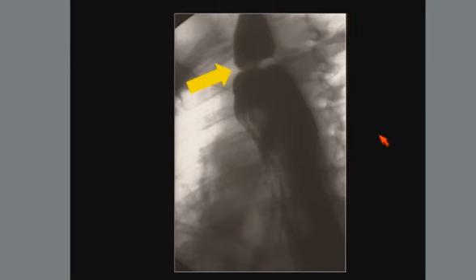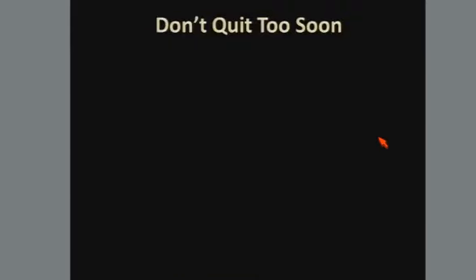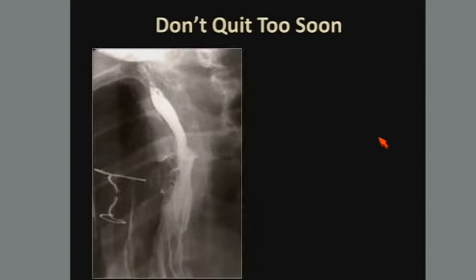So this is what a normal gastric pull-up looks like. Patent anastomosis, no leak. Gastric body is pulled into the chest, and remember, because they've been mobilized, they've been denervated, and they typically don't empty well. So this is a patient population where it's particularly important to make sure that you drain out the contrast before you send them back to the room if they're obtunded or if they came on a stretcher.